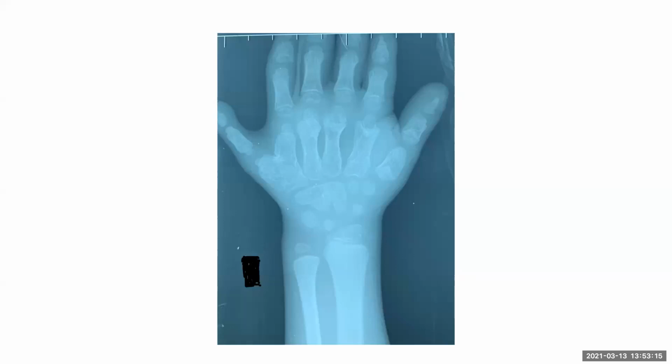Actually, there is 1, 2, 3, an accessory finger, with fusion of the two metacarpal bones. And the patient is short-statured, and this is, I think, classic for some syndrome, which at the moment I cannot recall.